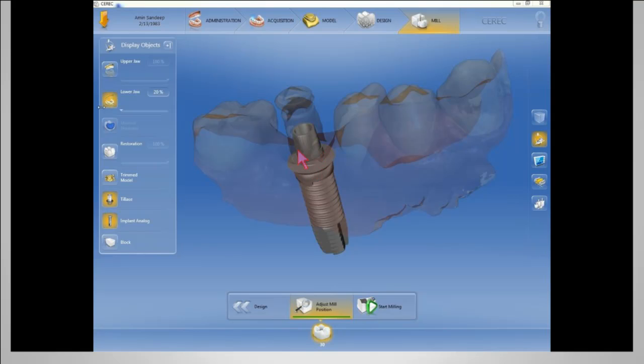Here is an image that shows the actual tie base that's virtually seated on the implant. Now this is the tie base that would actually get glued or cemented to our CEREC restoration. Again, this tie base could also have been used intraorally, but you can see that this tie base seats very subgingival, making it difficult to detect the notches and lining up the prosthetic components.